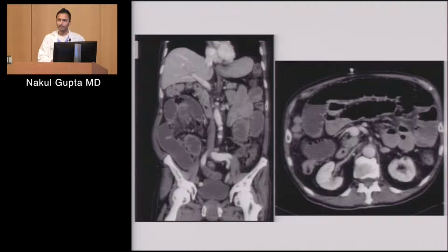All right, so you don't need to kill too much time on this one. A lot of small bowel loops that are dilated here. And so this would be consistent with a small bowel obstruction. And in this case, I can say on these images that this is most likely an obstruction, not an ileus, because I also see right here some decompressed bowel loops, which I can assume are going to be distal to these more dilated ones. So if I know that I have dilated small bowel loops on one end and decompressed loops on the other end, there has to be an obstruction somewhere in between, right?